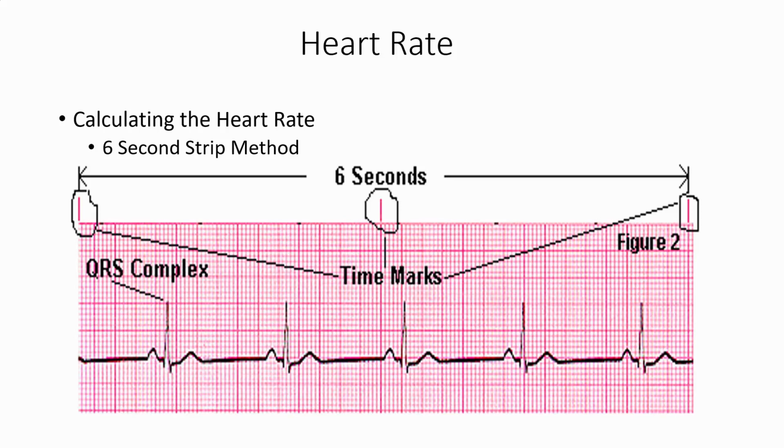The fourth thing we're going to look at is your PR interval. When you're looking at your PR interval, what you're looking for is, one, is it within normal range? So normal range is 0.12 to 0.20 seconds, okay? So no more than 5 small boxes. And the other thing you're looking for is that your PRs are constant, meaning whatever this PR is, well then this PR needs to be the same, and this one needs to be the same, and this one, and this one. So that's what you're measuring.